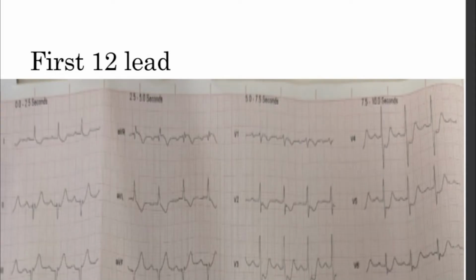While you're on scene, you might as well just do a 12 lead. So this is your initial 12 lead. Pause the video, just take a quick look and see what you guys think of this 12 lead. We're going to go into dissecting it a little bit later.